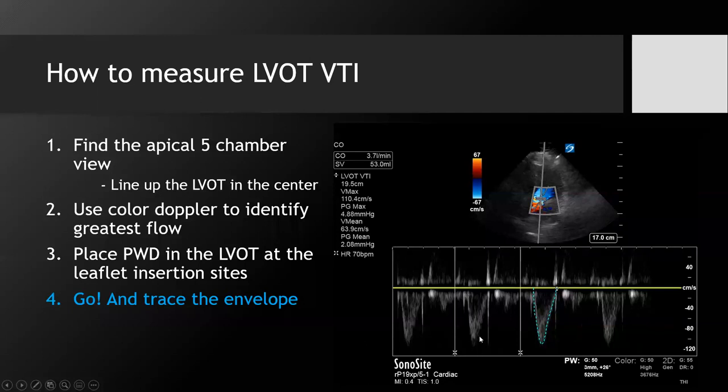So that angle correction is not changing the sensing, it's actually just adjusting the calculation on the back end? Yes, this angle correction is just adjusting the calculation that the machine is doing in the background using that equation that I showed, that hopefully was correct.